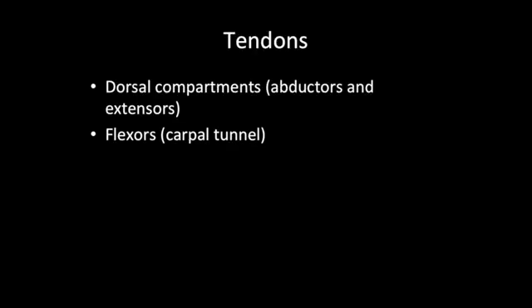We're going to be reviewing basic MRI anatomy of the wrist. This is intended as an educational tutorial for medical students and junior residents. Let's begin by discussing the tendons of the wrist.